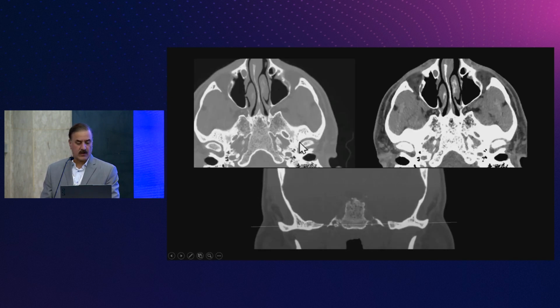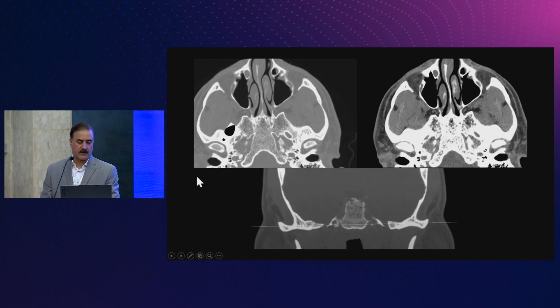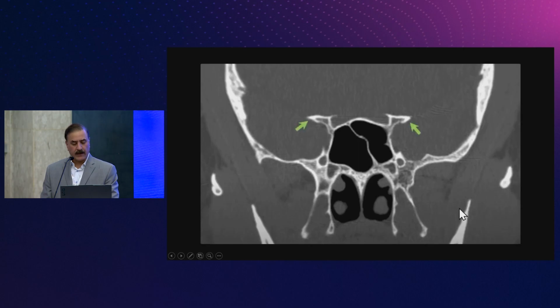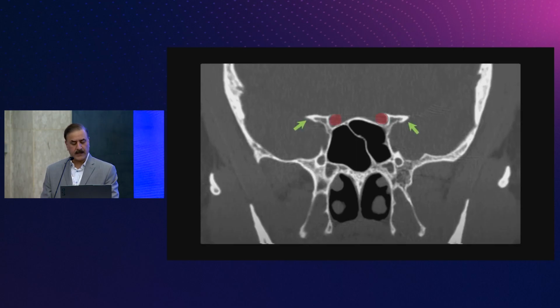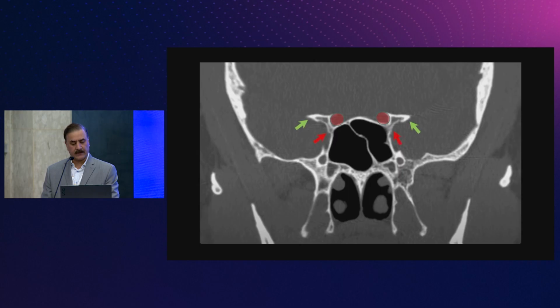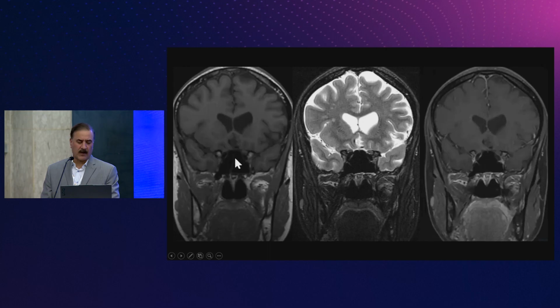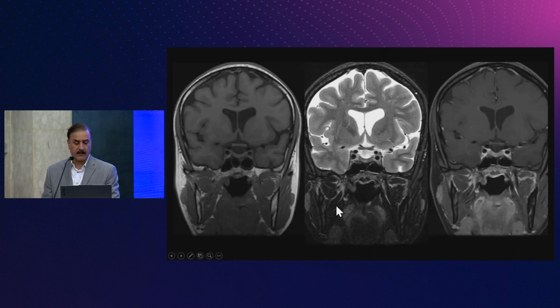spinosum. And that's ovale and spinosum, and of course we already said that, a lady with the high heels, and the footprint is exactly the same like that. And on the coronal image, that's your foramen ovale. So clinoid processes, optic canal, struts, the Vidian, the rotundum. You can see that on MRI also. You have on pre-contrast T1 image, you will have the bone that will have some fat signal in it, and then as you scroll down, you will see the rest of the anatomy.